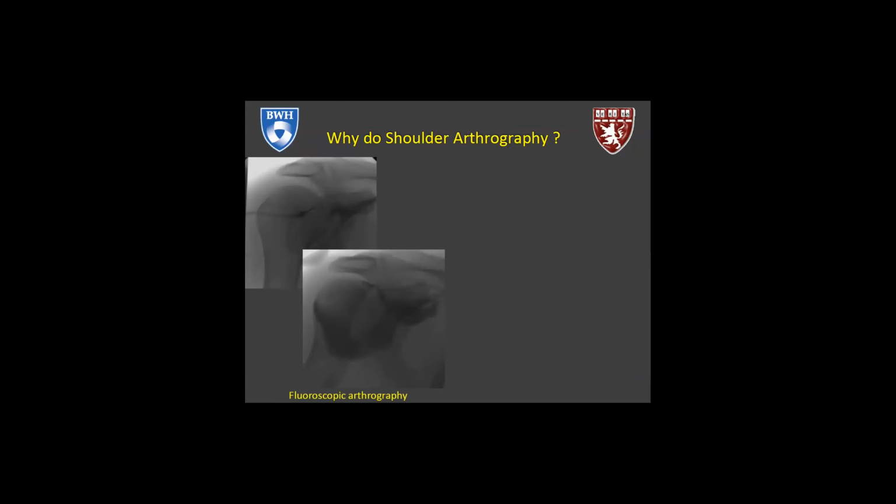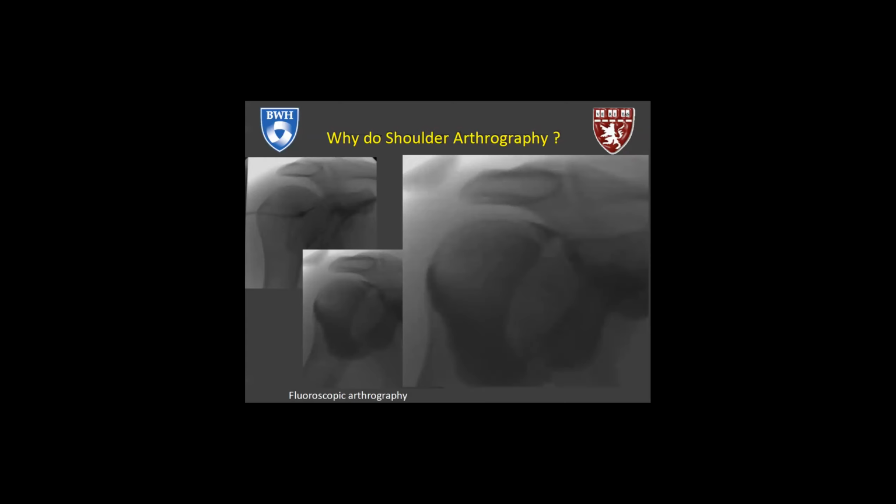So first of all, fluoroscopic arthrography, the main purpose of this is to really distend the joint. And what this does, it allows us to see the separation of soft tissue structures better. So recall under X-ray and fluoroscopy, there's really 5 densities that we see. And of all the soft tissues, all soft tissue looks the same, whether it's muscle or bone or cartilage. And in order for us to separate them out and improve the image contrast, we really need to add another density in there. And in this case, it's contrast.